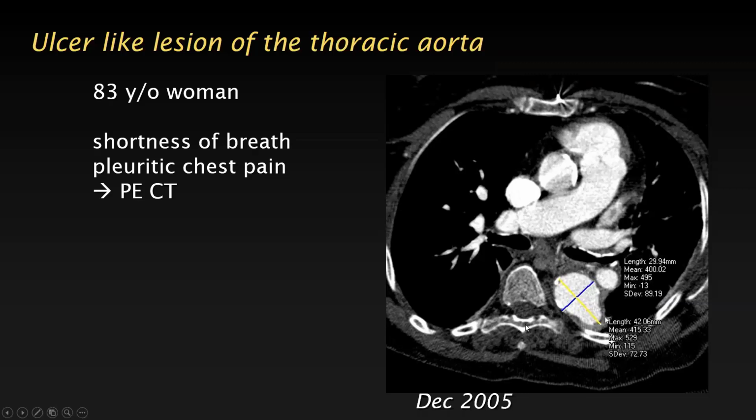If you have such a large acute penetrating atherosclerotic ulcer, you would expect some severe back pain or other dramatic symptoms rather than a little bit of pleuritic chest pain. But again, you're never sure with symptoms if they are bad enough. And then we would also obviously like to see an IMH, because if this was an acute PAU, you would have to see at least some fresh blood around that lesion.